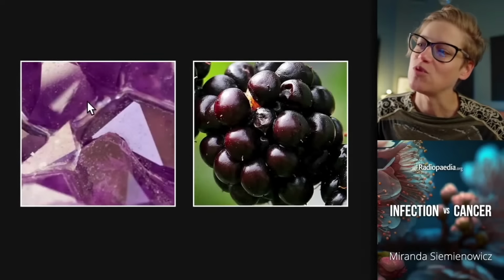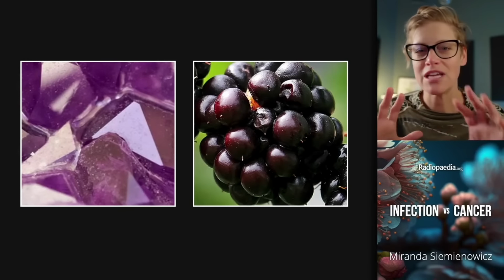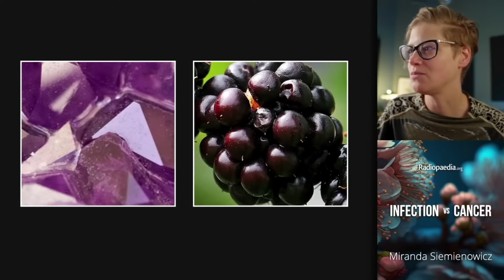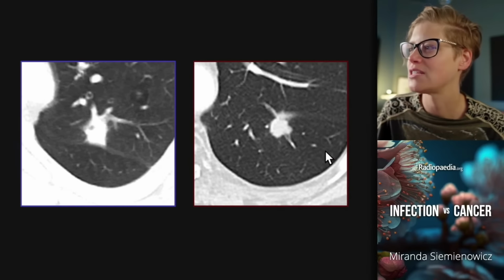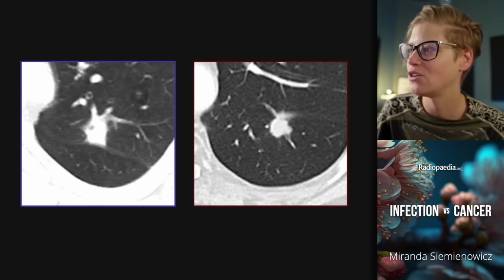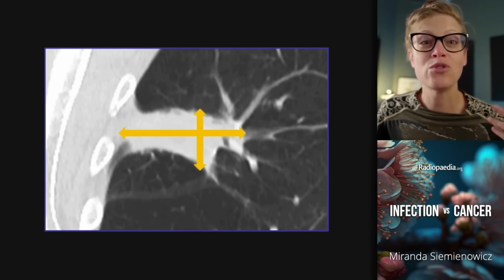So what have we talked about? We've talked about looking at the margins of a lesion, looking for those normal secondary pulmonary lobules with the angulated margins, the polygons, the hexagons, the malignant contour with microlobulation. We've seen that even in small lesions with 120-degree margins, flat margins, as opposed to this sub-centimeter microlobulated adenocarcinoma included for your viewing pleasure.